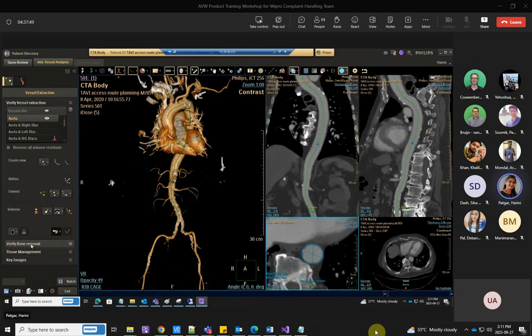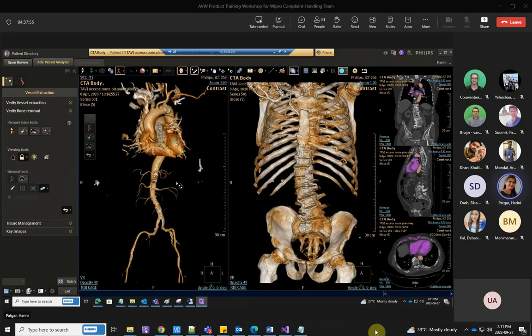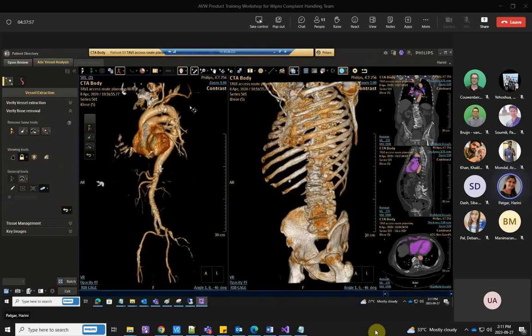But application specific, as I was telling first, my interest would be, when I work on the application, I will try to see whether my bone is removed perfectly. For that, maybe some remove residuals, so that the parts over here are removed, or you can use the sculpting tool to remove the masses what is available here. You can play across different tools here. So this will pick from here and put it into the bone view.